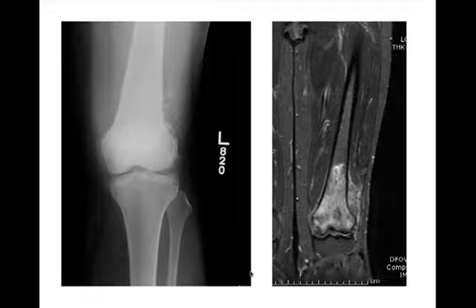Osteosarcomas are lesions that love to occur about the knee, so distal femur is a favorite site. There'll be geographic lesions, but they will have scary features about them, such as a wide zone of transition, cortical breakthrough, aggressive periosteal reaction. So if you see something like this, certainly osteosarcoma is something you want to think about. The MR in this case is really just for staging, just to show us the extent of the tumor. We should be able to say something smart about what we think it is based on the radiograph alone.